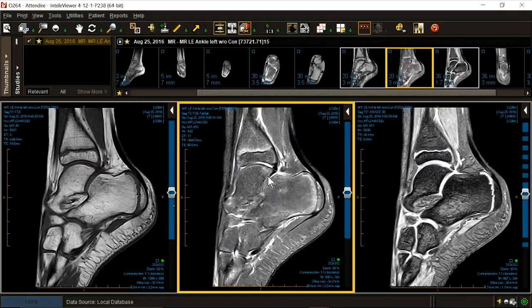The key: subcortical edema in the absence of a synovitis or a capsulitis. For certainly in a capsulitis or a synovitis, you could get reactive subcortical swelling. This patient has no capsulitis, no synovitis, no JIA, which is the only other differential diagnostic consideration, although transient. You can toss it out. This is complex regional pain syndrome, type 1, previously known as the artist Prince. No, previously known as RSD.